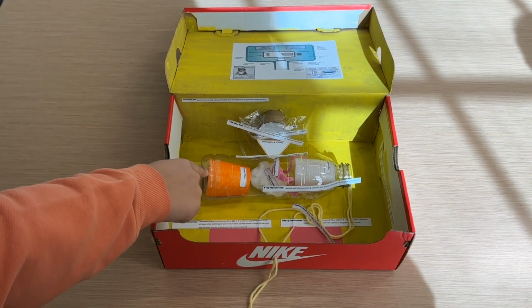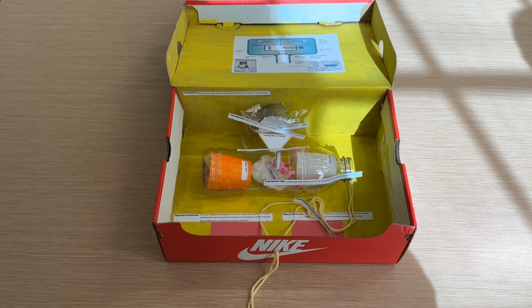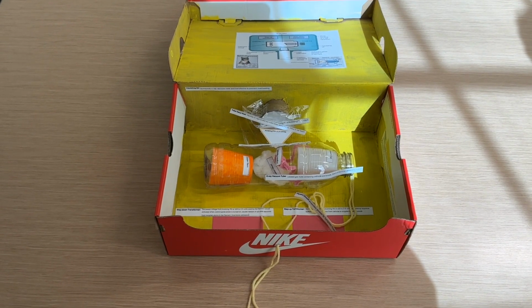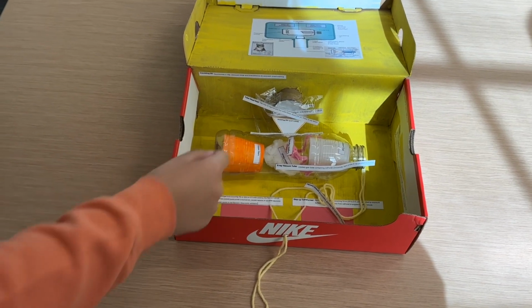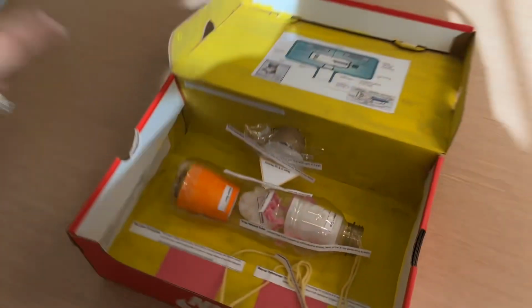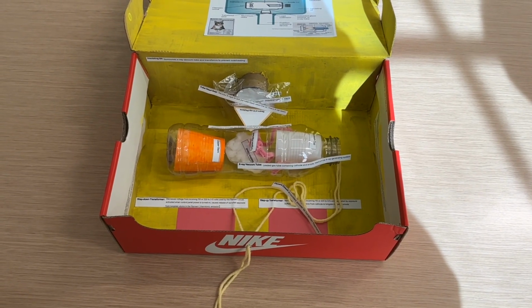The plastic bottle represents the X-ray vacuum tube, which is a leaded glass tube containing the cathode and anode, and is also known as the heart of the X-ray generating system. Next, we have the copper stem, which dissipates heat away from the tungsten target, which is located right here. We also have the molybdenum cup, which focuses electrons into a narrow beam towards the tungsten target.